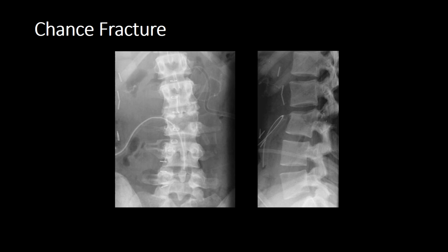And so therefore, to get an empty vertebra sign, it must mean that the spinous process has been distracted so that it no longer appears on the AP view within the vertebral body. So we have this horizontal fracture through the spinous processes, it goes through the pedicles, it then comes out, there's a little line through here, and then it comes out through the superior vertebral end plate. So this is a really unstable injury.